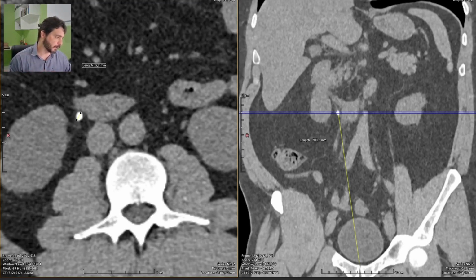This is because I have to stop and mumble a bit to say the correct word in English, because I'm thinking in Portuguese. So what else? Yeah, partially filled urinary bladder, and the appendix is okay.